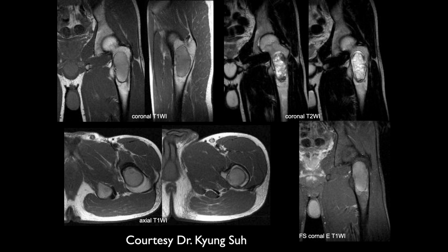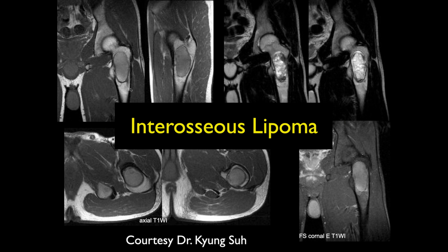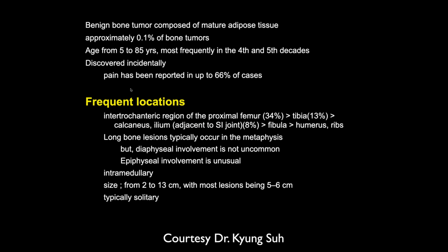Is this that liposclerosing? Yeah, well, that was my first thought. I think this is kind of a category of those myxofibromas. The pathologist in this case called this an intraosseous lipoma, but my guess is myxofibrous lesion, and that's a very common location for it.